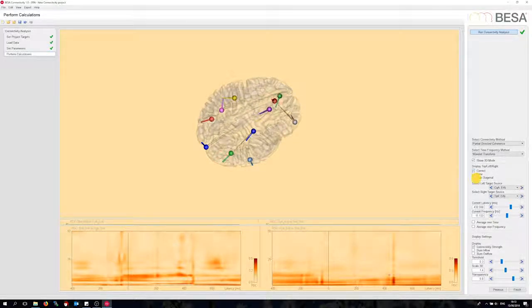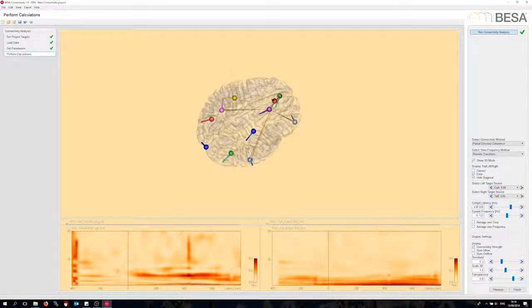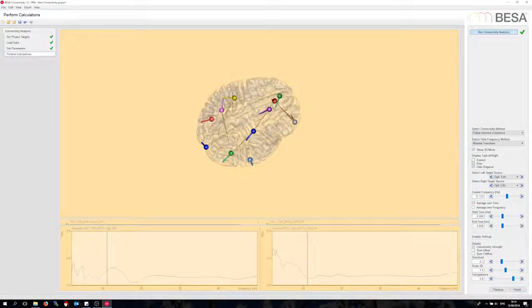It may make sense to average over the time segment where this processing takes place, especially in this case of late responses. Let me average over time from around 300 milliseconds to 450 milliseconds.